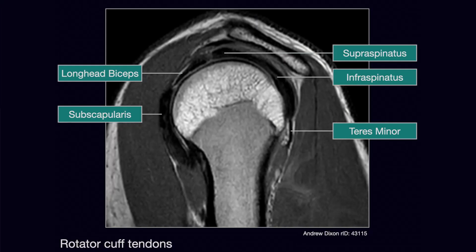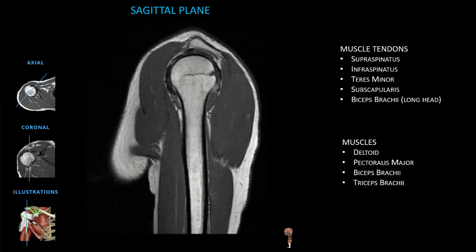In this sagittal view, we see tendons of 5 of the muscles we have just discussed. Note the tendons are dark while the muscles are gray color. Without looking at the muscle labels, think about how you would identify anterior and posterior on this patient. The key feature is the acromion of the scapula. That is posterior. Now you get to identify the structures listed on the right. Pause this video to find them.